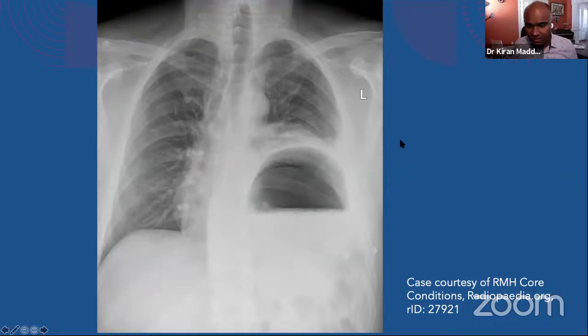Okay, this is a chest radiograph in a young patient who came with trauma. So anybody wants to talk about the findings here? The damage is done on the left side. Very good job, Salim and Abdulatif. There's a stomach bubble, a large gas bubble, Victor. Everybody did a wonderful job here.